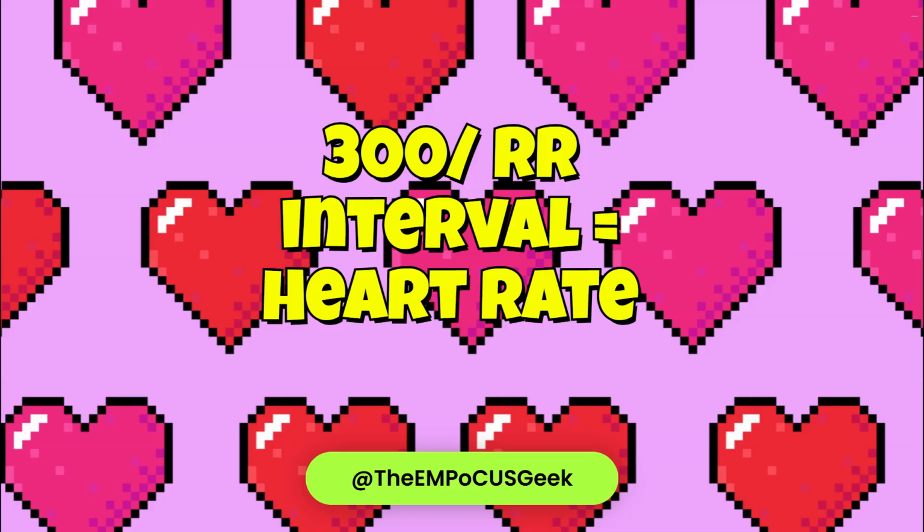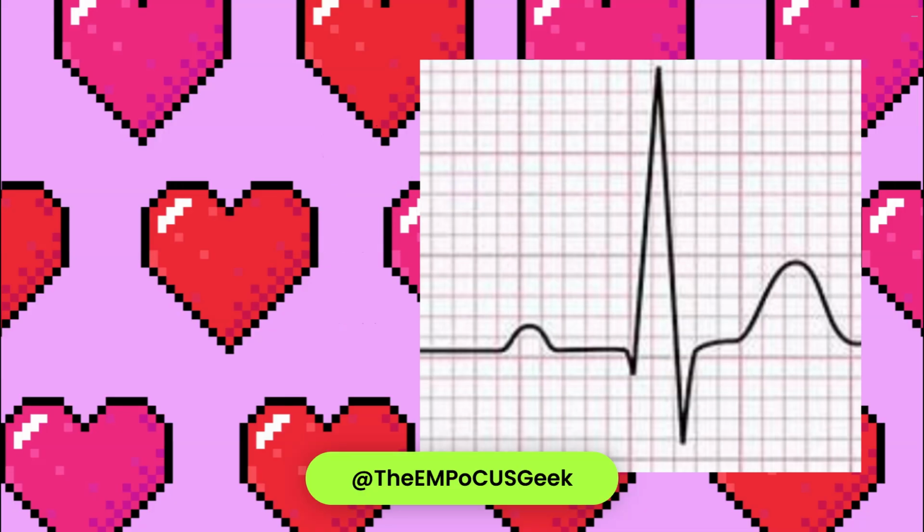We calculate the heart rate by looking at the RR interval between two adjacent heartbeats. If the RR interval is equal to one large square, then the heart rate is 300 beats per minute. If the RR interval is equal to two large squares, then the heart rate is 150 beats per minute. So, in essence, how we calculate the rate is by dividing 300 by the number of large squares we get as the RR interval.